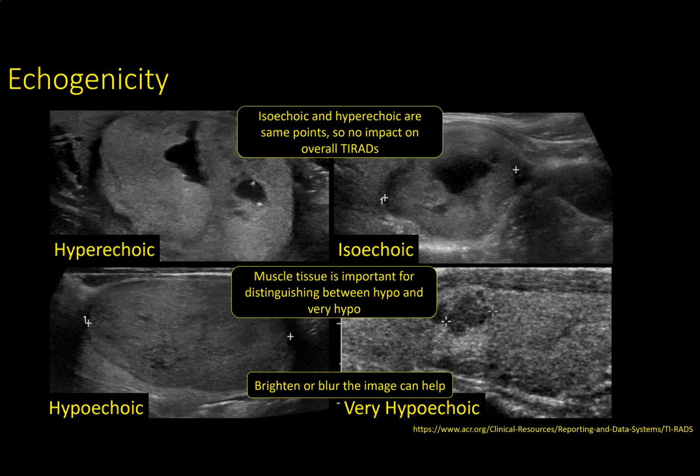Sometimes you may try to brighten or blur the image. You can try squinting, you can zoom out on your PACS, you can increase the gain on your ultrasound machine, or even try increasing the windowing, for want of a better word, on your PACS system.